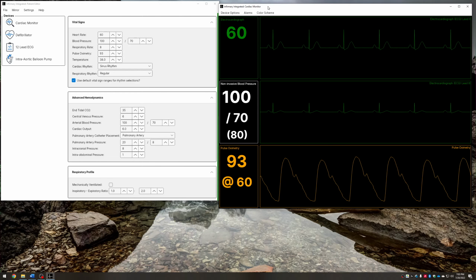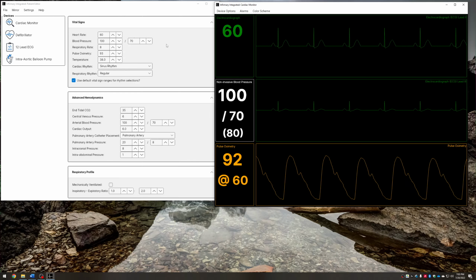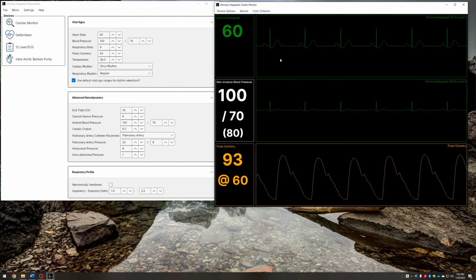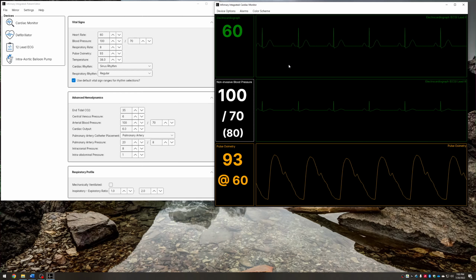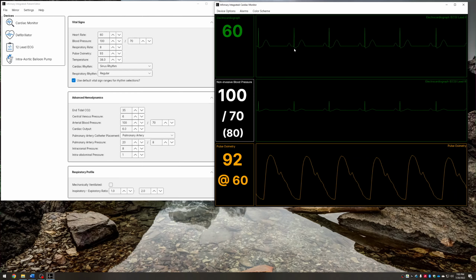So to explain that a little differently, this cardiac monitor is actually reading the number of heartbeats that this digitally simulated patient is beating. Much in the same way, it is making these waveforms from this actively running cardiac cycle of this patient model that is happening in the programming.